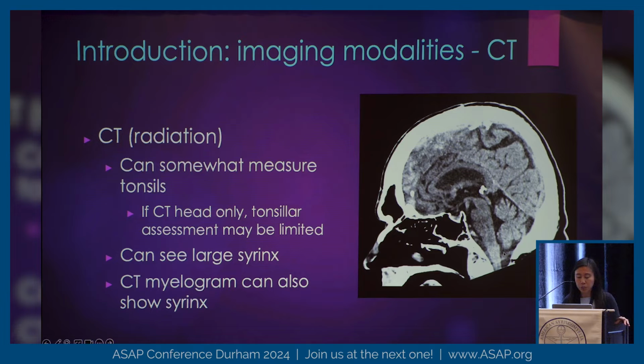So even on this image, you can see that the brainstem is dark, dark, dark, and it suddenly turns bright. That's only a very mild aspect of artifact in this case. Sometimes it's very bright and I can't see a thing. So that limits what we can see at the craniocervical junction. You can see sometimes the top of a Syrinx. If you do a whole cervical spine, even a real Syrinx, you may not be able to delineate all the details of it. Because again, if you look at a CAT scan, all the tissues are very similar in density. They don't differentiate that well compared to MRI. They're all similar shades of gray, whereas on MRI, they're much wider shades of gray.